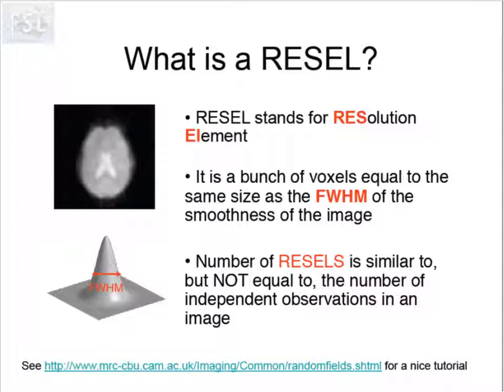And a really important thing to note if you're using this method, which is the voxel option for correction of multiple comparisons in Feat, is that it makes a lot of assumptions about the smoothness of the image in order to fit these Gaussians to it. So it's going to work okay at the first level, but at the second level it only works well if you've got quite a large sample size or if you've smoothed your data a lot.